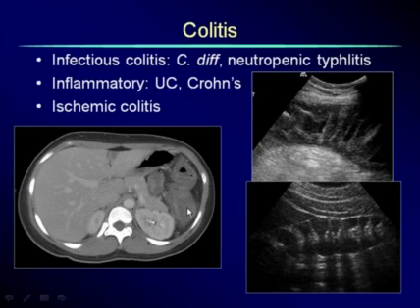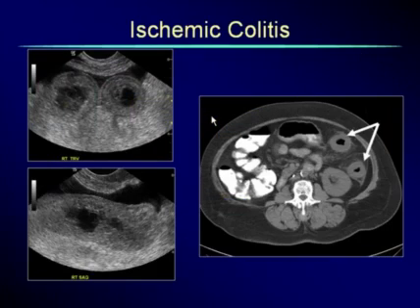These patients have colitis. The differential includes infectious colitis, C. diff, especially Clostridium difficile in hospital patients, inflammatory ulcerative colitis, Crohn's disease can cause this, ischemic colitis as well. These are all in our differential.